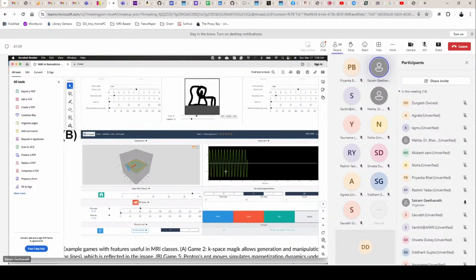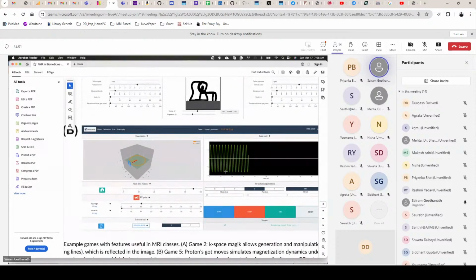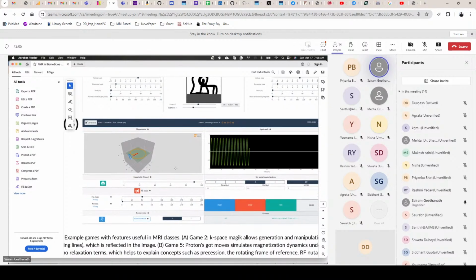And like I was mentioning, in this case, this is in the laboratory frame of reference, you can see that the rotating frame is unchecked. So you can actually see a sinusoid happen. And this is the coolest thing. If you also have hardware to go along with this, which is what we're working on now, to be able to show that the same phenomenon happens in hardware when you build your own hardware, if you get it right.